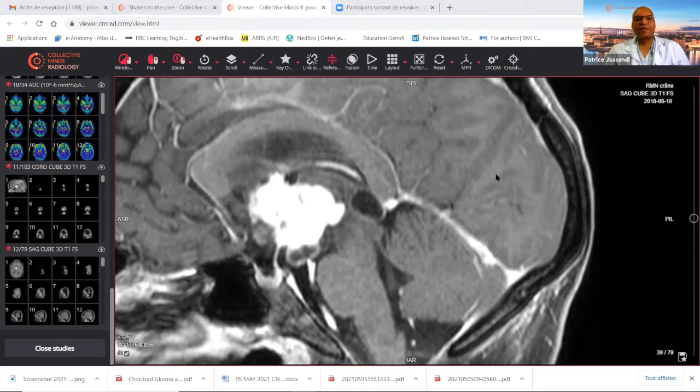So the 3 that remain are intraventricular CNS lymphoma, craniopharyngioma, chordoid glioma of the third ventricle. It's nice to see live the evolution of the votes. Okay, the final result shows that some of you have changed to chordoid glioma of the third ventricle, which is really the first differential diagnosis of the final diagnosis. So it's not that one, but it's really similar in MRI features. It shows the same features as the final diagnosis.